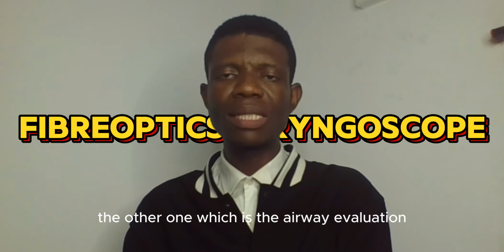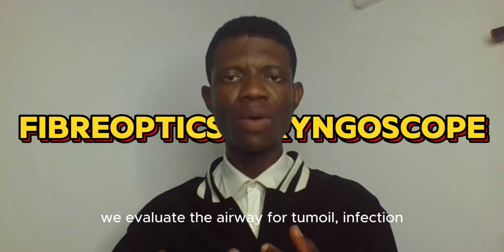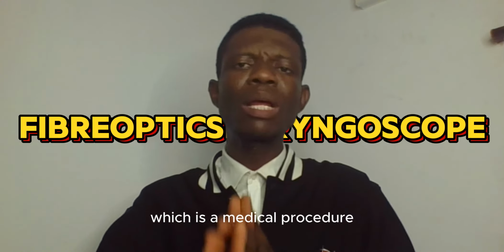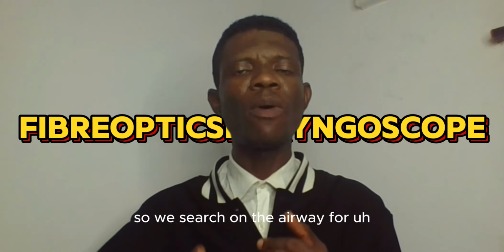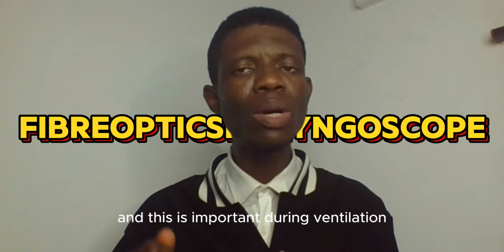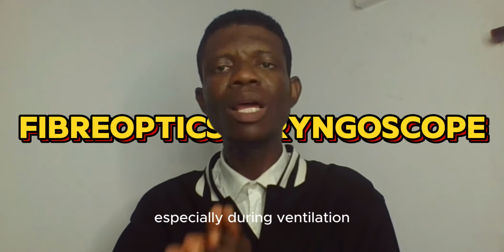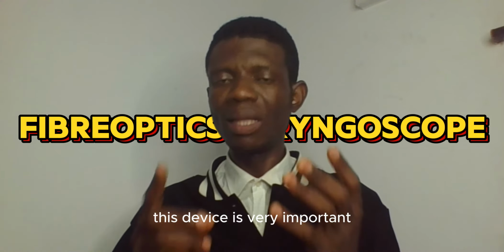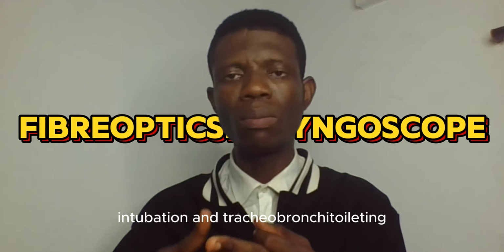Now, the other one is airway evaluation. During airway evaluation, we evaluate the airway for tumor, for infection, and for tube placement. Then there is tracheobronchial toileting. It is a medical procedure which involves the suctioning of the airway system. So we suction the airway for foreign bodies like mucus and sputum, and this is important during ventilation because when these are not suctioned, they can occlude the airway. So these are the reasons why this device is very important. Three uses that I've said so far are the airway evaluation, intubation, and tracheobronchial toileting.